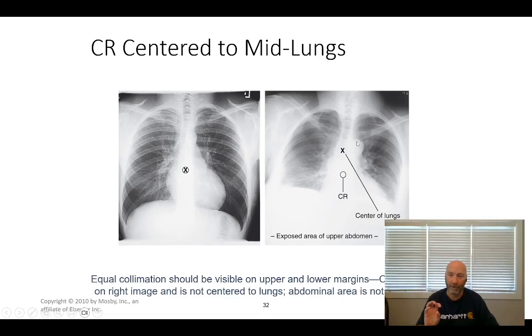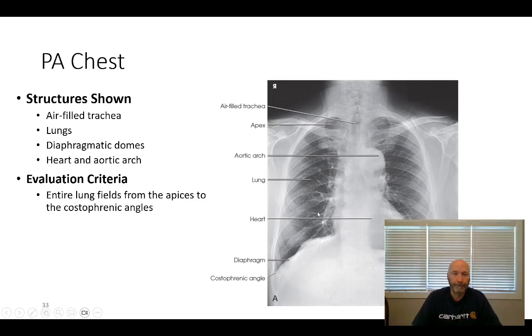That's where the aorta comes out of the top of the heart, and it makes a 180-degree turn and goes down and eventually becomes the abdominal aorta. So what you're looking at is as if you're looking straight down onto the aorta as it comes up and makes that turn. So that's the aortic arch. The clavicles should not look like they touch the aortic arch. And we'll talk about that here in a minute.